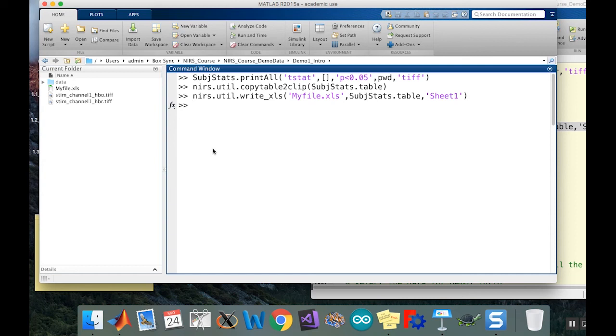I think if you do this, and we'll see later on that we use the same when we start to do group level and so on, we might have 10 files, in which case at the first level we're going to have 10 statistical variables. If I feed it in here and say my Excel file and subjects, and this was an array of 10 entries, it'll actually save each one into a separate sheet automatically. So a lot of stuff works like that.